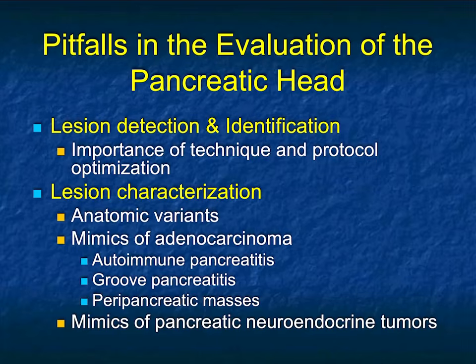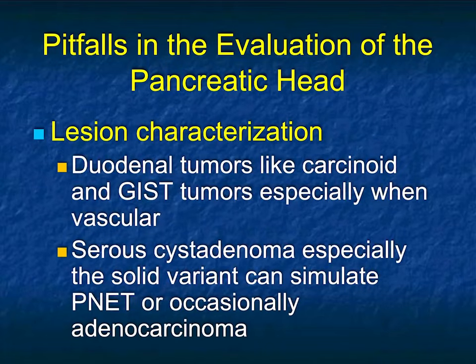And again, neuroendocrine tumors, they're usually hypervascular, probably 80+% are hypervascular. But when they're hypovascular, they can really simulate a pancreatic cancer. In terms of duct dilatation, neuroendocrine tumors can be centrally in the gland, in the duct proper, or simply be near the duct. So you don't always have duct dilatation, but it can be somewhat challenging.